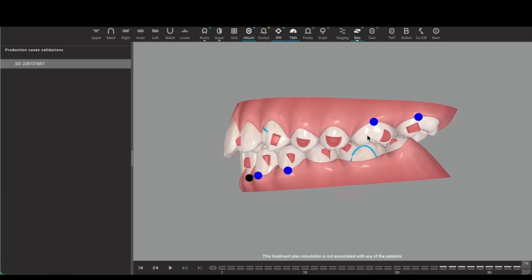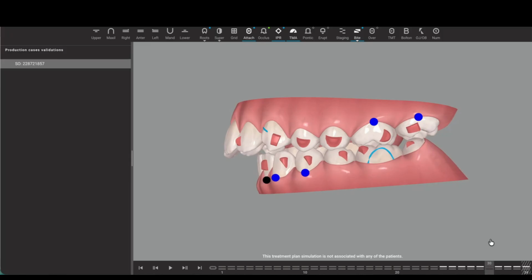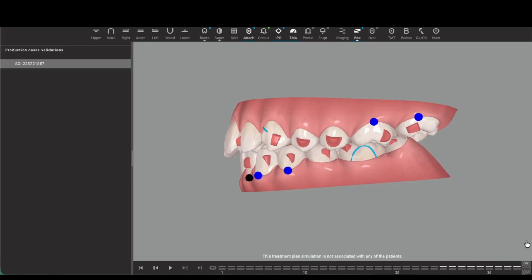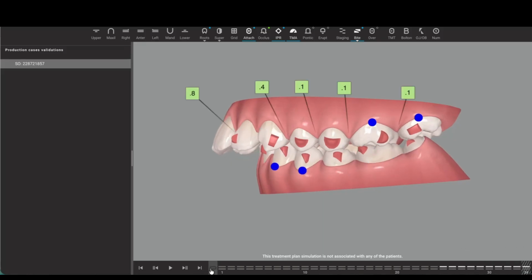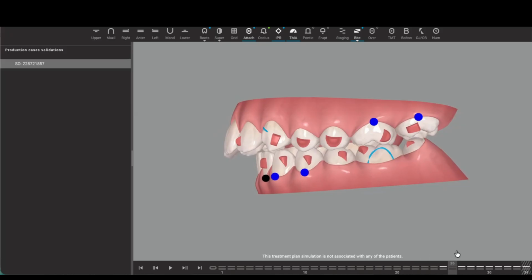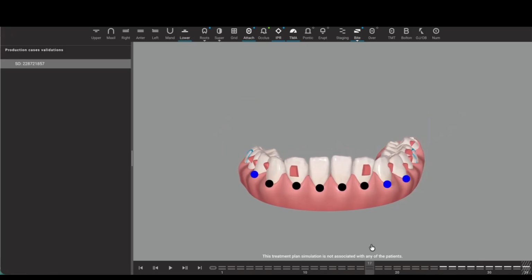But this attachment setup is very close to what I approved. And the other thing you'll notice is this has 30 active stages and 4 passive stages, 4 passive aligners, which are worn while the patient is waiting for their next set of aligners. So 30 stages of intrusion mechanics. And these are now my coded custom deep bite staging with alignment and then intrusion.